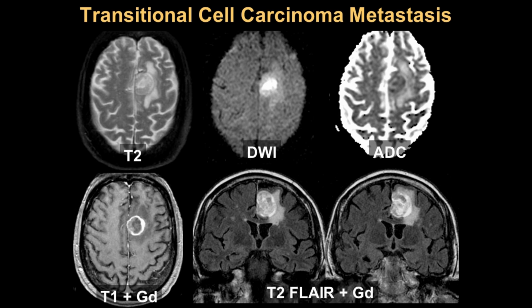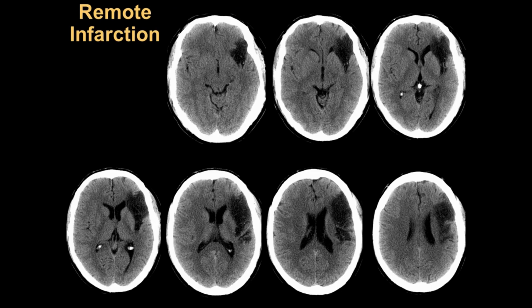Now, in other cases, when we get to our middle-aged years, besides post-traumatic epilepsy, another very common cause is tumors, either primary brain tumors like glioblastoma or astrocytoma, or more commonly, metastatic disease. So from the imaging standpoint, middle-aged patient, new seizure, this is one of the rule-out diagnoses, and it's why contrast is included for our screening brain protocol in that setting. And what we're looking for is not hard to find, typically enhancing lesions like this metastatic focus to the superior frontal gyrus.